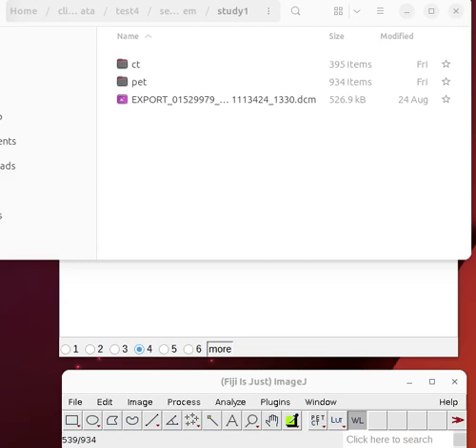I would like to make a demo on some data which I received, which my program refused to read, and it made a mess. And this is the original data. What is expected is that on the lowest level of studies, you'll have no naked files. The only naked file which is allowed is called a DICOM-dir. A DICOM-dir is basically a map.